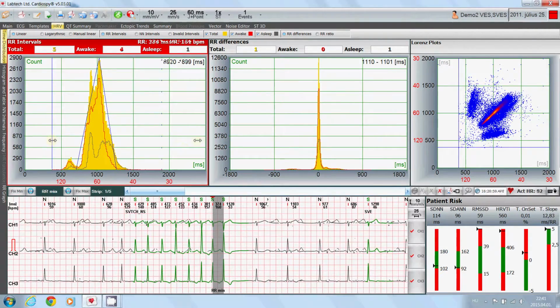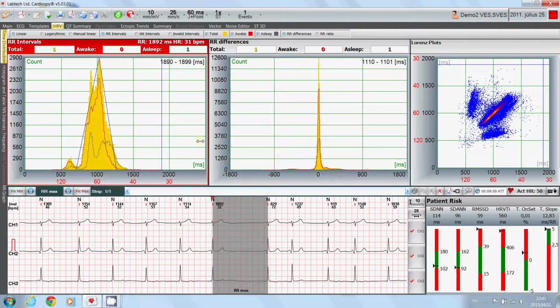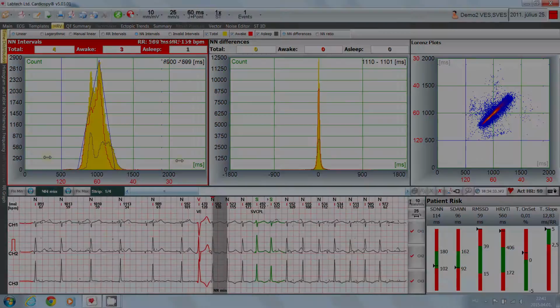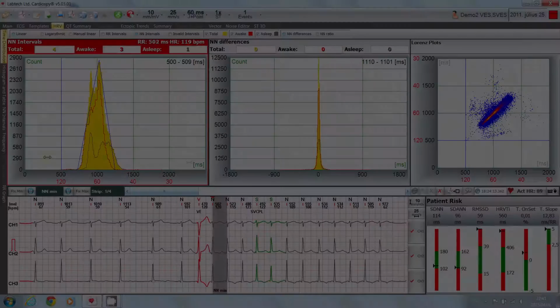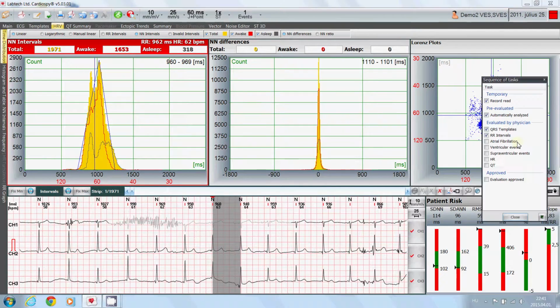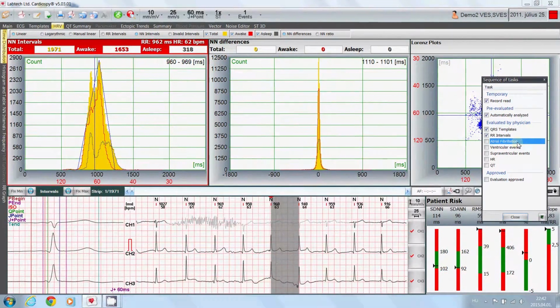You can do the same with the maximum RR interval. Also, if a recording contains many non-normal beats, you may want to separately do this for the NN intervals. So we have completed the RR intervals and now continue with checking the record for atrial fibrillation.